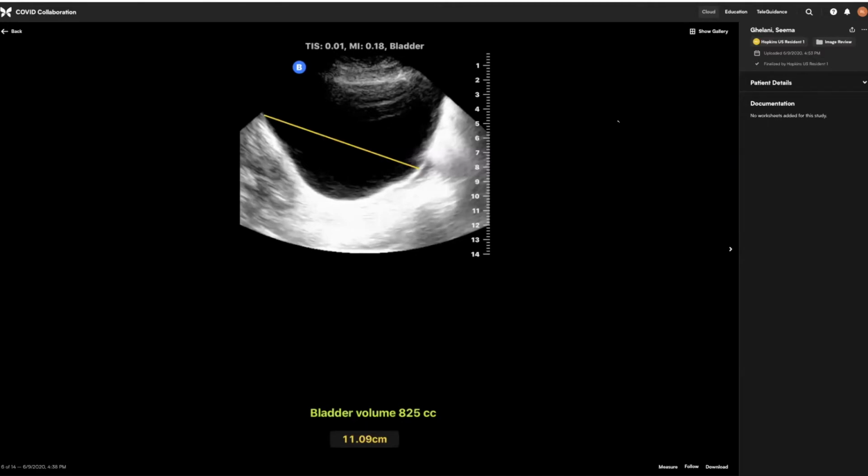So really cool study, and just wanted to point out the anchor image concept. The other thing is, and I'm going to put you a little bit on the spot, Rachel. Everybody knows in a transverse image, top to bottom, left to right, to measure the 2 dimensions of the bladder. But in the sagittal image, I see a lot of variation in the way that people measure the height of the bladder. Do you have any tips or any approach that you like to teach for your trainees in terms of, do they go for the greatest distance in terms of height? Do they go left of screen to right, directly across? How do you like to have people measure bladder height?